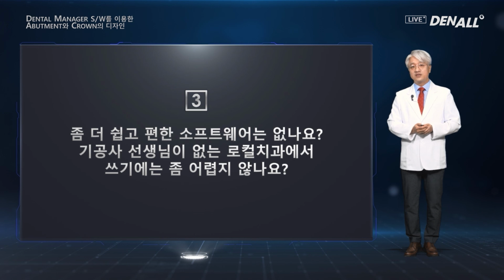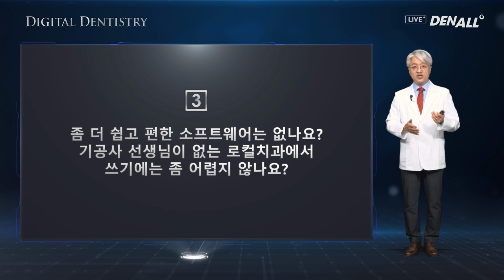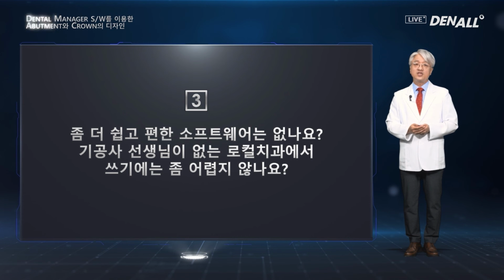Right now, using the software, depending on the clinic's situation, may be a little bit difficult. But as I said before, if you practice and make efforts within a short period of time, the prosthesis can easily be designed and printed using a printer or milling machine. And then you can share the work with your staff easily. It depends on how you approach it in terms of your thinking. And I think it's not that challenging to use the system, the solution.